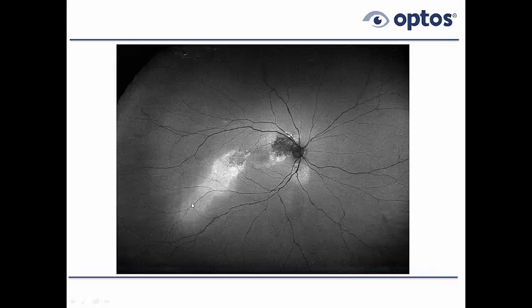And that zone, as we'll see again, we saw it once, but we'll see it again in comparison, is really pretty much invisible to ophthalmoscopy and to standard color imaging. It's also a zone of abnormality below the disc, and there's something in between. As you can see, it looks like the macula is not quite perfect. Acuity is only down a little bit because the macula is only minimally involved.